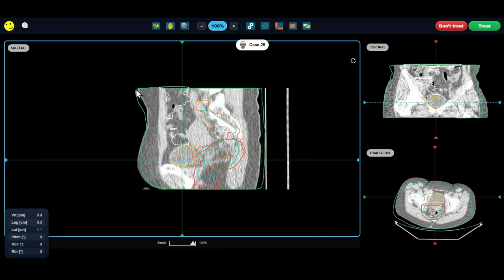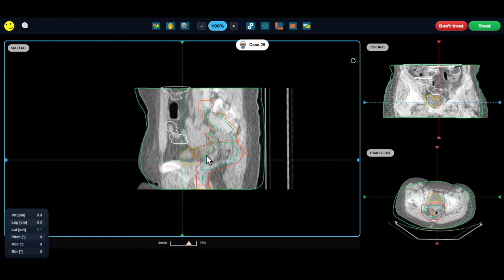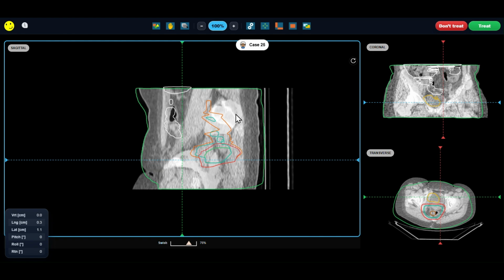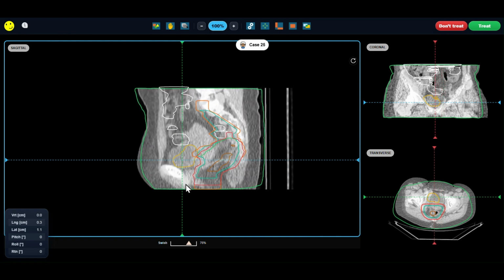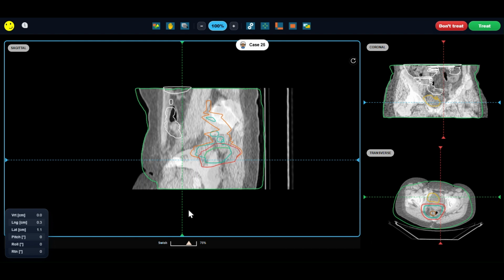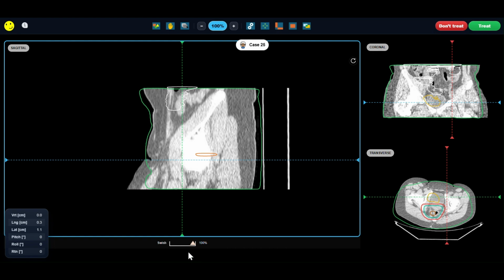Yeah, so there's a contour difference here, which may be an indication of weight loss. As we did mention earlier, the patient did not eat during the weekend, and they've had lots of bowel motion, which could explain why this patient has contour change here. Right, and is there anything else you can notice?